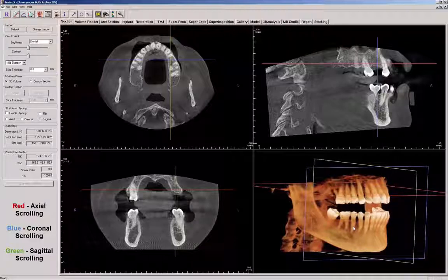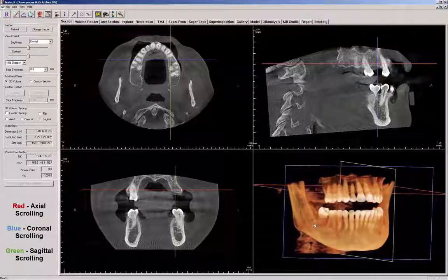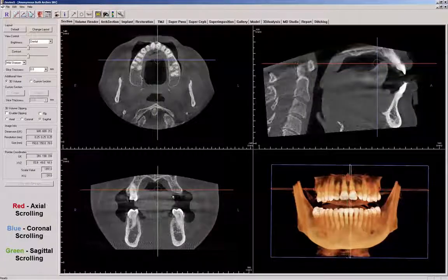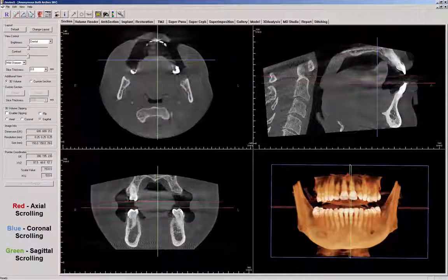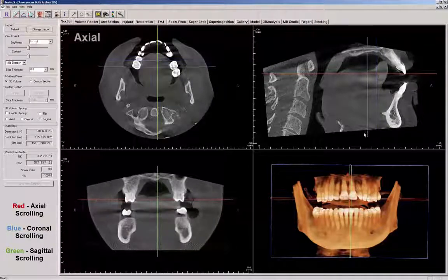These planes are represented by a different color and will move as the anatomical locations within each viewing window change. Each view window has multiple contiguous thin slice sections which are interrelational. We can scroll through the entire depth of tissue as the field of view will allow.